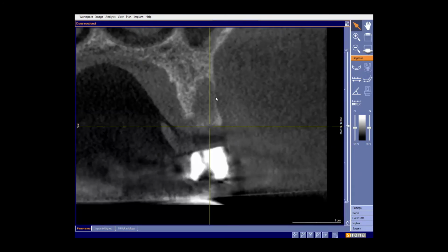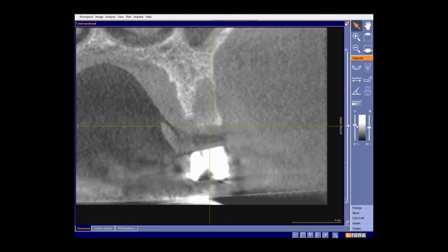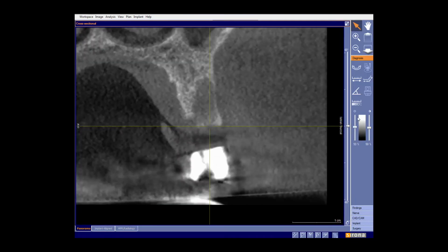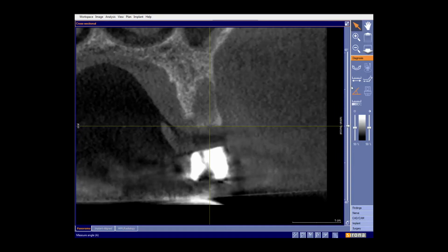I've enlarged the screen here, and then I will use some of the tabs on the right to look at different functionality here, including changing the contrast and brightness of the scan to outline the socket. I will also click on the ruler icon to allow me to measure both vertically and horizontally. One click, then a second click will give you a vertical or horizontal measurement. When you're finished with this, right click the line and click the remove box.